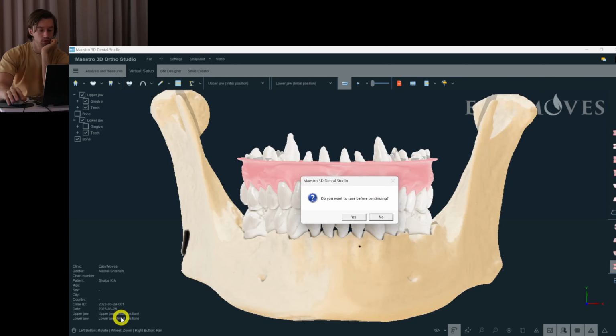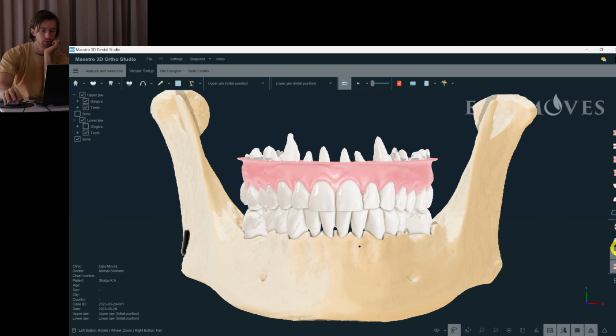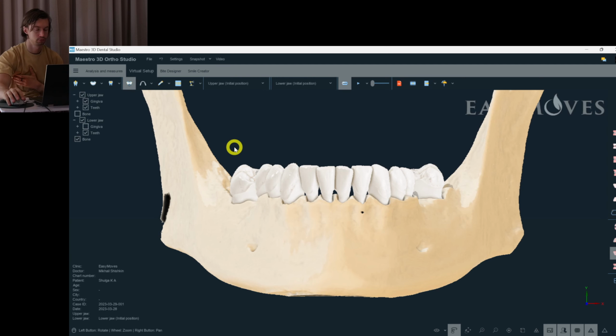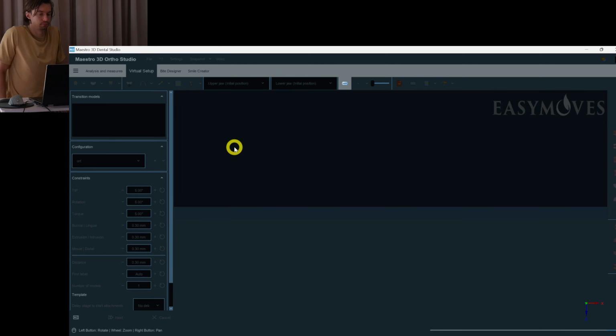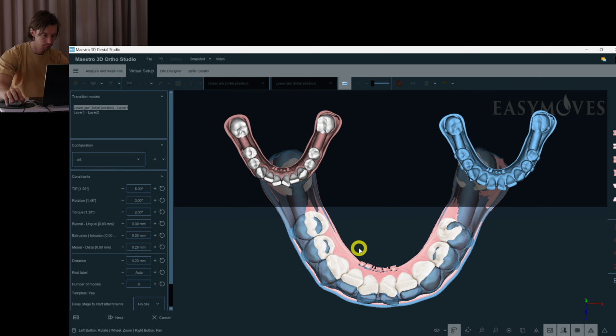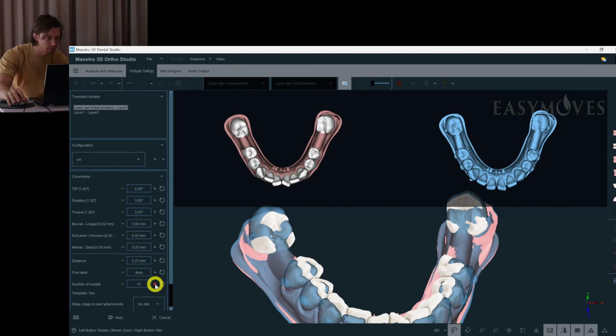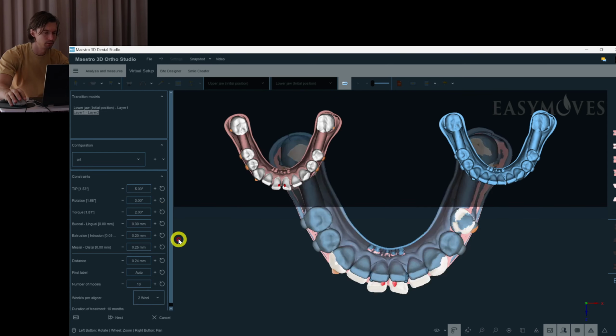Okay, now we will see how many aligners we need to produce to let this case go. We go to the models builder and check the numbers. At least 9, but I think we expand the canines here, we distalize here. No, I think we can go even down to 10.